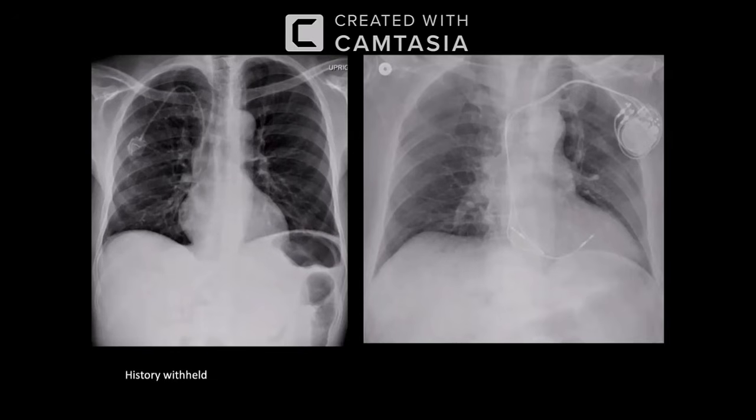The bones appear normal. I can see that there is a high density area in the right subdiaphragmatic location. In my normal practice, I would zoom and make the contrast better to see it.